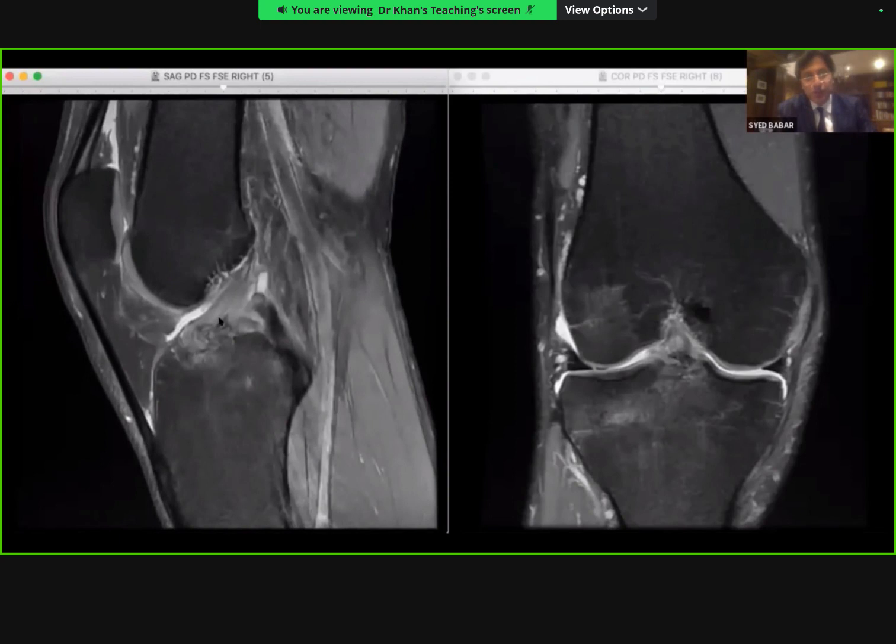But in addition to the marrow edema, look at the shape of the fibers of the ACL. Why is it curving around? It shouldn't be. It should be a nice taut structure. And all of the edema is centered here. So you can't really make out, but I would be really suspicious that there's something going on at the bony footplate. In other words, an avulsion fracture is what I would be thinking of, the tibial component, not the femoral component, because the femoral component you can still see parallel to the Blumensaat line, which is the roof of the intercondylar notch. So the problem seems to be here, but of course we will confirm all of this.